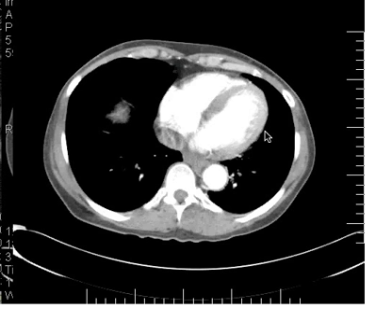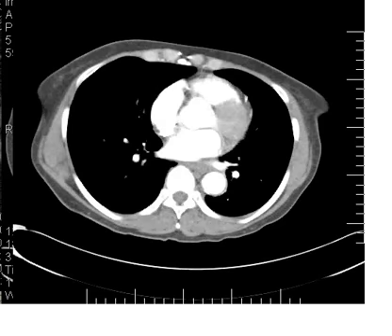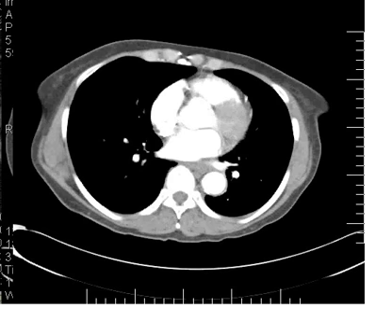So this is the best way to identify the left ventricle right at a glance, that thicker myocardial wall. So you have left ventricle and right ventricle, and therefore you know right atrium and left atrium. So that gives your orientation. So if this is the right ventricle, well, the pulmonary artery should arise up from it. So if we go superiorly, you should start coming into the pulmonary outflow tract.